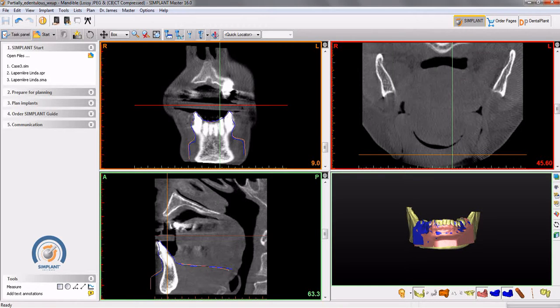Today we'll be taking a look at the panoramic curve and advanced tips on how to use it to visualize the anatomy. Just starting off, the panoramic curve has been traditionally used to bisect the arch of interest and then observing a panoramic slice, as we call it. So let's take a quick look.